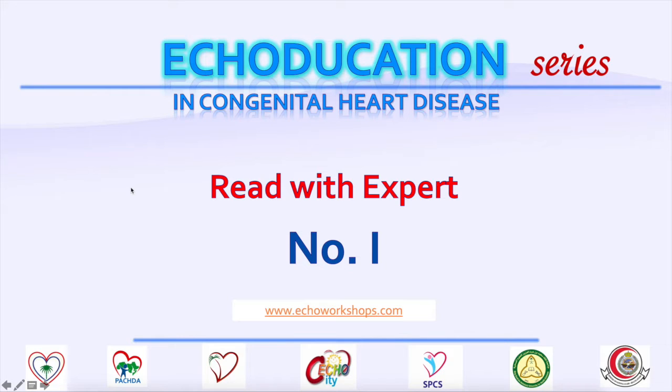In this session, we will go over 5 echocardiographic cases in which we will try together to reveal the important echo findings with its anatomical and hemodynamic significance.